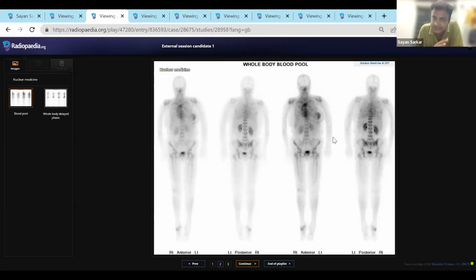I get the part that the origin is not very clear, it's a bone scan, not an anatomical image. But you said it can be neoplastic. Are there other possibilities other than neoplastic? Yes, infection and inflammatory conditions also show uptake on the bone scan. Are there any other areas of uptake in the image that you have not described? Maybe in the salivary tissues, in the nasal mucosa. No, I mean the bones.